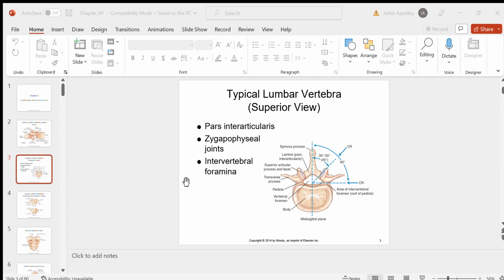Okay, also notice, laterally, we have transverse processes easily visualized. What we don't see in this image, we don't see several things, but one important thing we don't see, right down the midline, is the spinous process, okay? However, if you take an actual vertebra and literally just turn it around, there you see your spinous process, okay? But on the radiograph you will see this. Because the spinous process is extra density, extra thickness for the beam to travel through, this area, right in the middle of the vertebra where the spinous process is, will show as a white line.